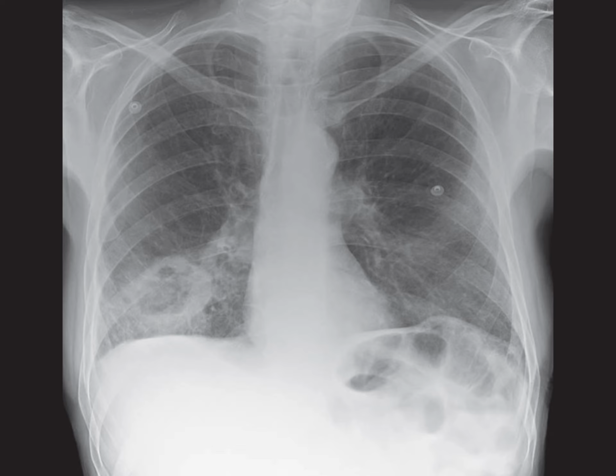If you take a closer look, you'll notice the irregular margins of the cavity and the presence of an air fluid level within, which are key findings. There's no evidence of bony destruction in relation to this lesion or elsewhere on the radiograph, which is crucial to note. Additionally, there's some airspace opacification medially to the lesion, but no other focal lung lesions are observed. The hila appear normal without enlargement.